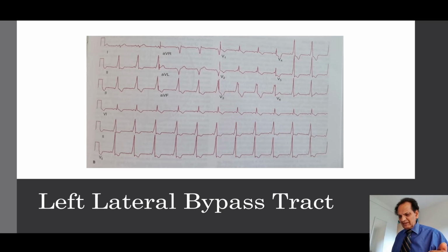Left lateral bypass tract. How do you know? The delta wave in lead V1 and V2. Classical picture here. That is a left lateral bypass tract, the most common of all the WPWs.